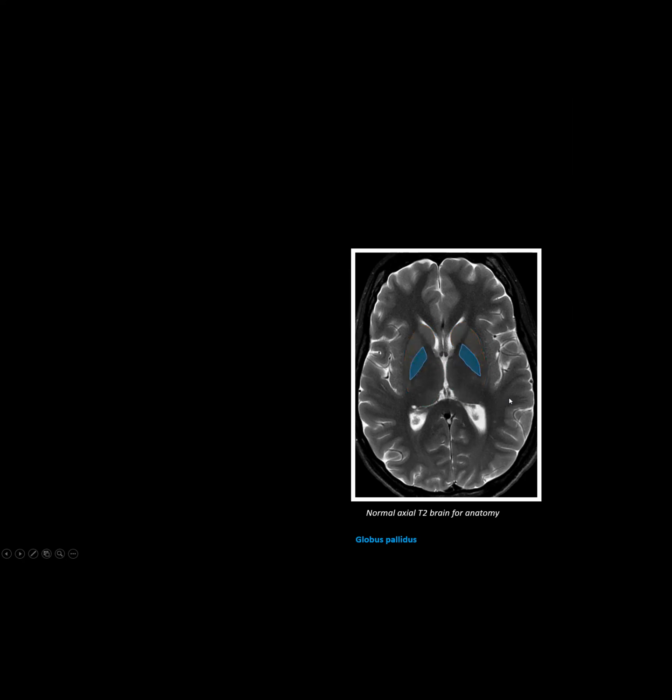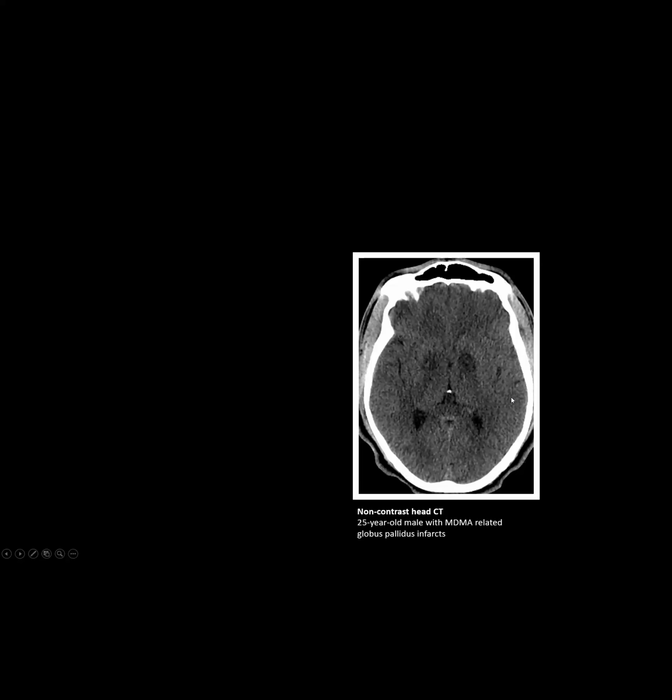So with that information in hand, if you have a case like this that has hypodensity involving your globus pallidus, this was actually shown in your in-service within the past 2 years. If you see edema or infarction involving the globus pallidus, there's a differential for that. One thing they talk about is that carbon monoxide can give you this appearance. Methanol intoxication and cyanide can also involve your globus pallidus.